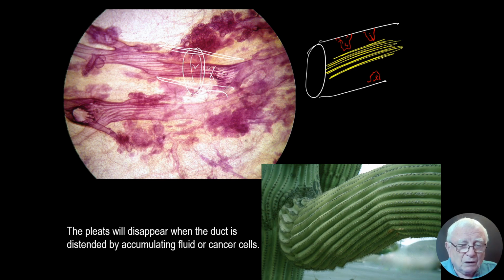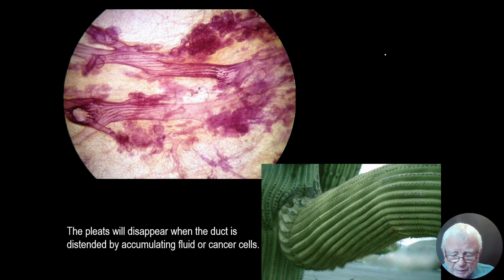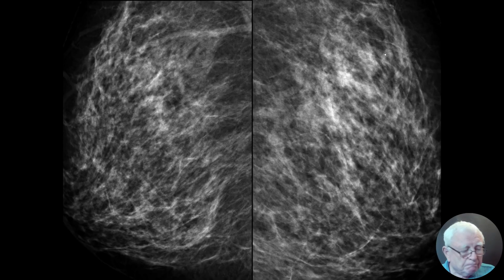And the radiologist can see it as a distended linear density. And later on, we are going to talk about the skipping stone-like calcifications, deceptively benign looking, like flat stones. These are malignant type calcifications in the micropapillary duct-forming carcinoma.